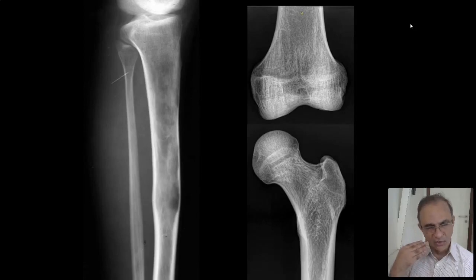The whole pathophysiology of skeletal dysplasia is again fascinating. Not all of this has been understood. Much of it is still unknown. We know that this happens, but in some important ones, we know why it happens. So besides that point, look at normal trabecular pattern on the right and abnormal trabecular pattern on the left.